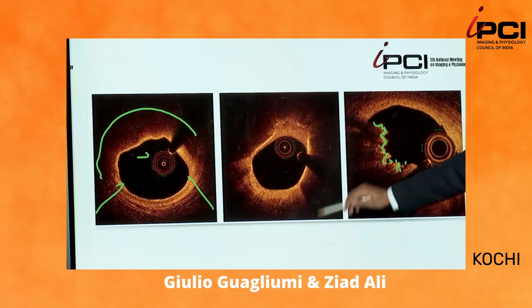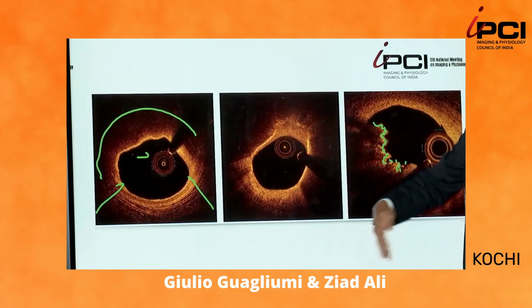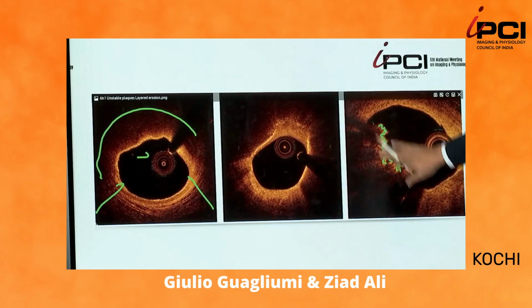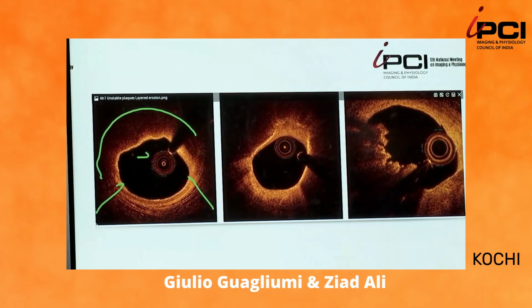This is not an unusual situation where you have layering of the macrophages and they come in together in a sort of hot plaque. Let's go to the calcified nodule for a second. Is this a protruding calcific nodule or an eruptive calcific nodule, and what's the difference? Okay, so it's thrombus. And thrombus makes what? It makes the surface irregular. Okay. So this is an eruptive calcific nodule. As you can see, it's got a jagged edge, right?